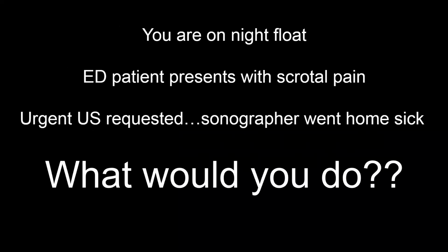I want you to just put yourself in this mindset. You are on night float. An emergency department patient presents with scrotal pain. An urgent ultrasound is requested. But the sonographer went home sick. What would you do? You don't have an option to do nothing, okay? So how would you scan this patient?